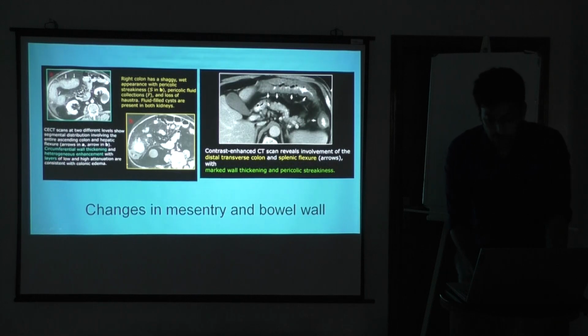In this slide you can see more clearly, so there is contrast, but there is a collapsed lumen with air. But you can see this bowel loop, how the white line is very narrow, but in this you can see how thick it is. That indicates submucosal edema. Submucosal edema, only way it happens is when there is ischemia or gross inflammation. So any abnormal thickness of the bowel wall is very significant.